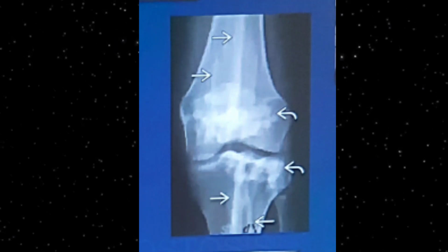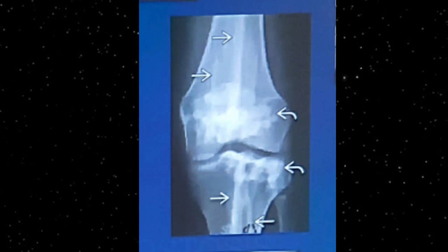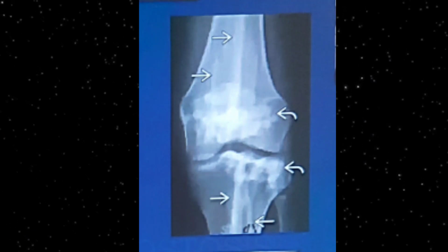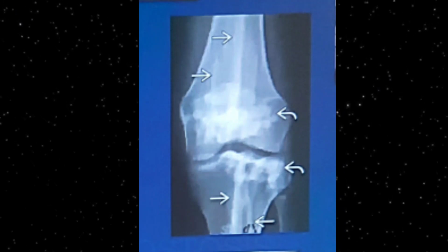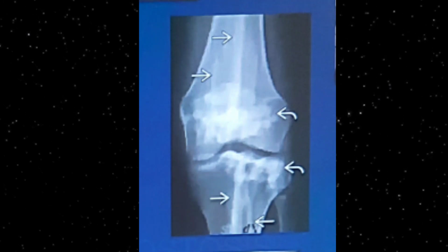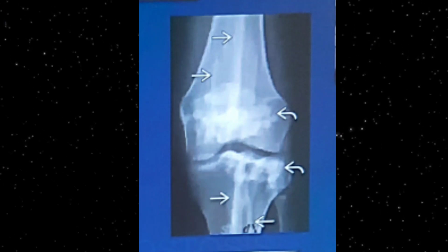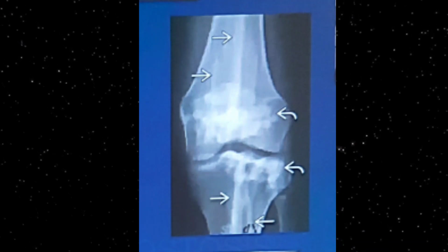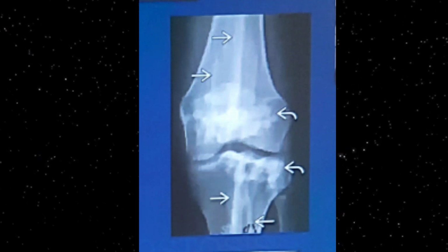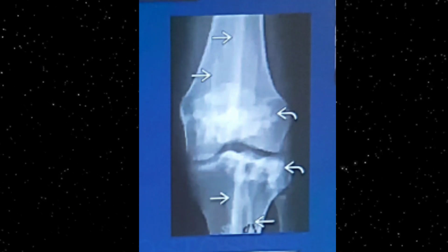It includes the interosseous sclerosis. It also includes some dripping candle wax appearances along the metaphyseal area, and a small sclerotic pattern can also be recognized on this radiograph. So these are the characteristics of Melorheostosis: the dripping candle wax appearances, which may be endosteal, periosteal, or interosseous.